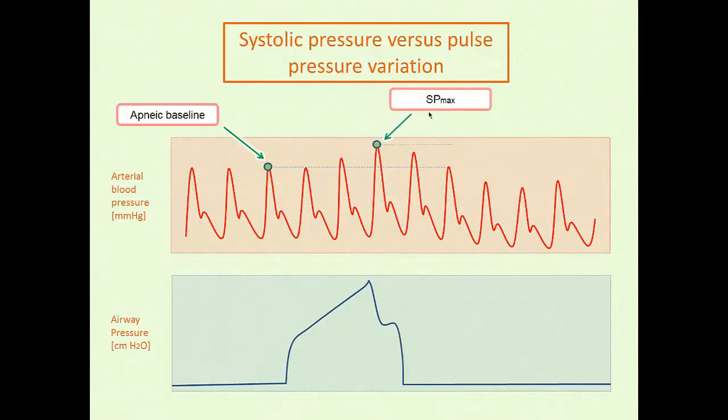So the systolic pressure max is up here, and that's relative to the baseline. Your systolic pressure minimum is actually down here relative to the baseline. Again, it's come down throughout a single ventilatory breath. And this difference here is called your D up or delta up. And similarly, this is called your D down or delta down, this difference here.